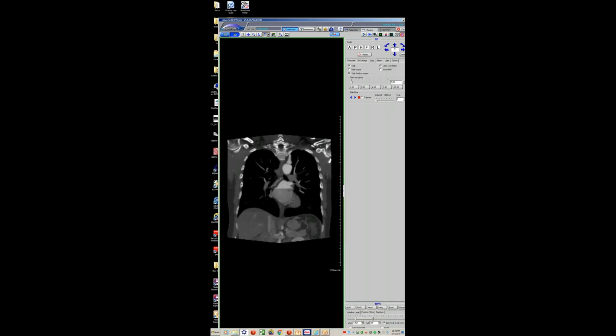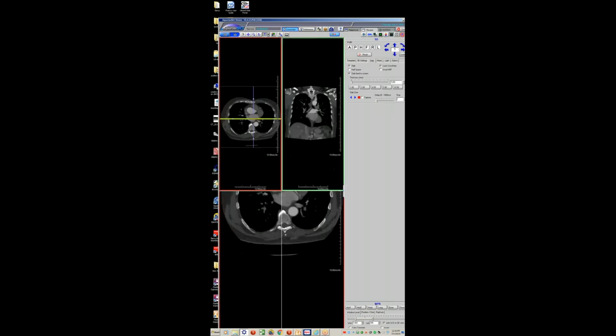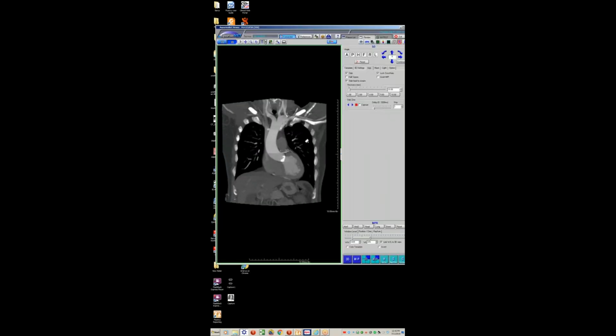So someone asked me, would any of you guys call this a cervical arch? To me, it's folded on itself, and it's kinked, and the arch does go high. Would you say this is a cervical arch versus a pseudocoarctation, or we've been reading things that say the two can occur together?